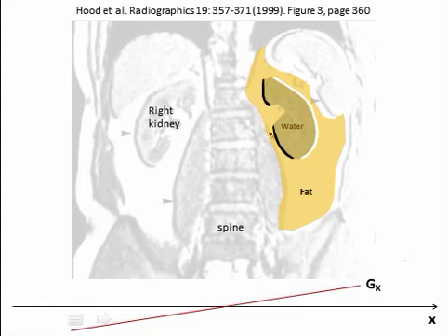Okay, so remember, we have these positions of the dark and bright band because of this polarity of the read gradient. This polarity of the read gradient tells us that frequencies on the right side of the image are higher than frequencies on the left. And since fat moves towards lower frequencies, fat will shift in this direction.